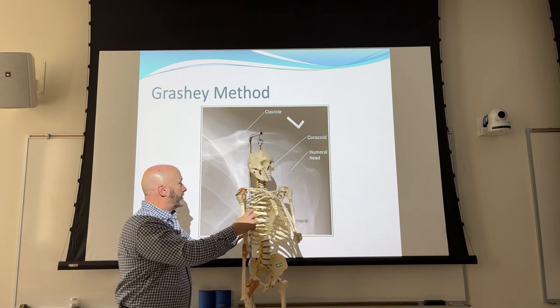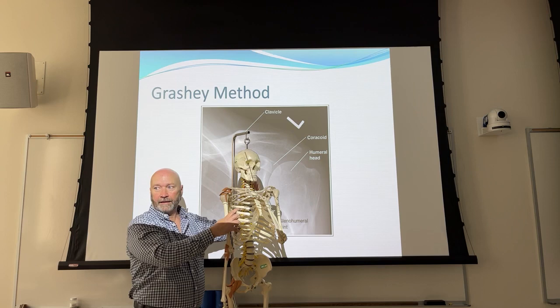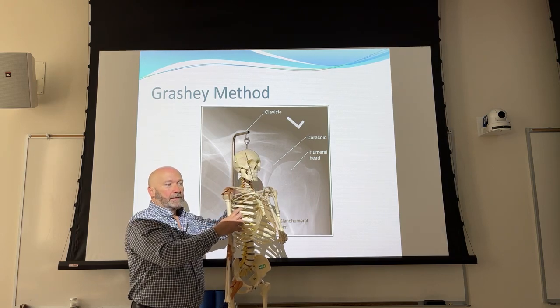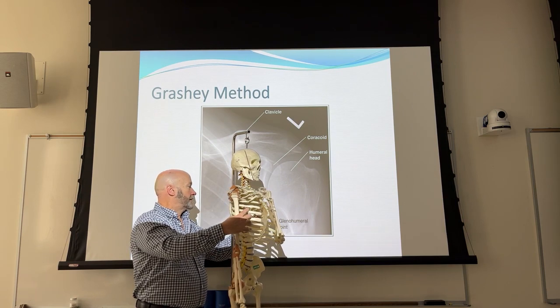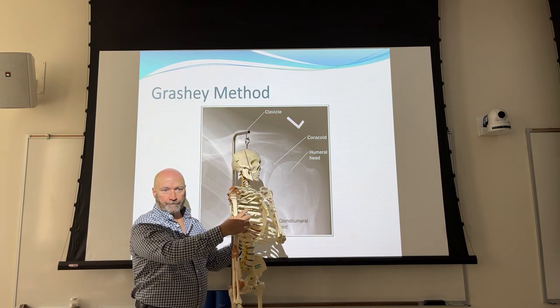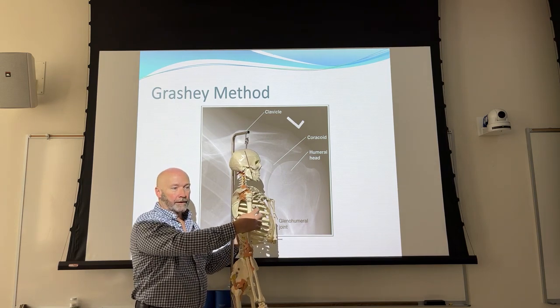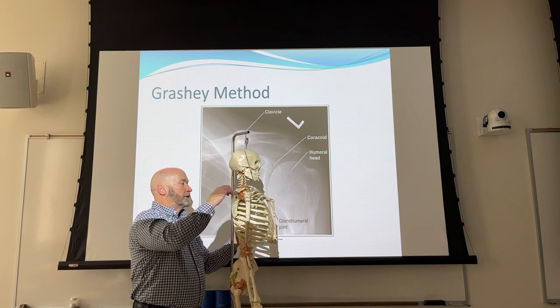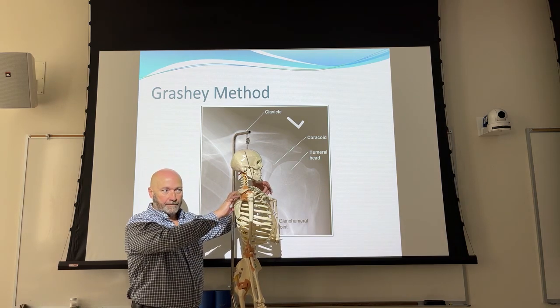Until, like on this image, it is actually in the joint space and over a portion of the humeral head. So as we oblique up further, we're going to get more superimposition of the coracoid process. Now, even on our shadow here, we've got superimposition over the humeral head. So the more lateral you become, over-rotated you become, the more superimposition you're going to get between the coracoid and the humeral head. Does that make sense?